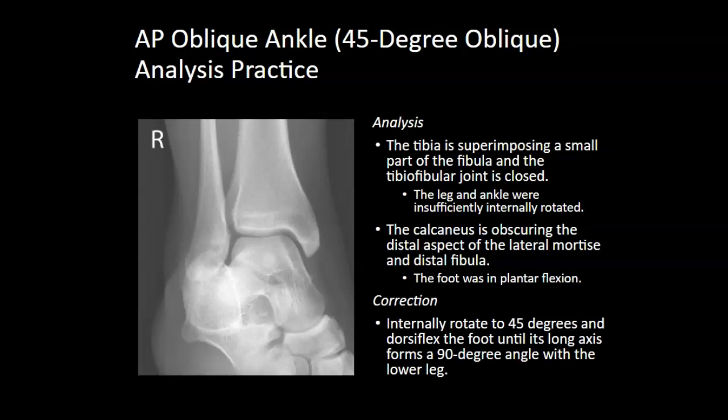We need to dorsiflex that foot. So in order to correct this image catastrophe here, we need to internally rotate that ankle until it's at 45 degrees and dorsiflex that foot in order to correct this imaging.